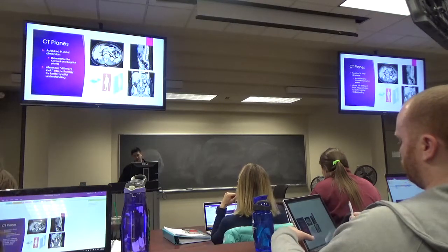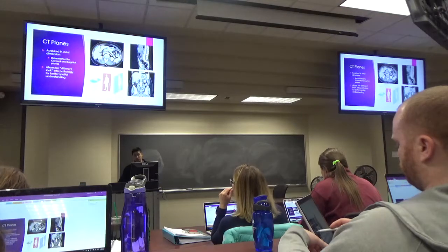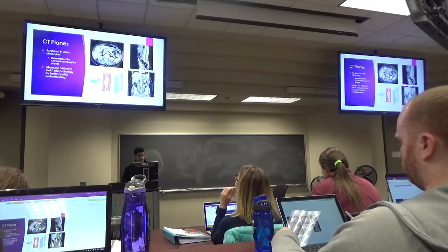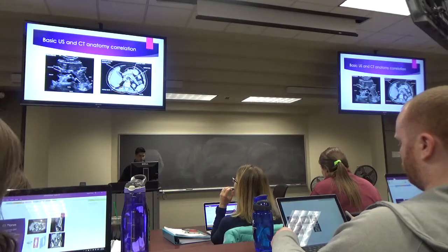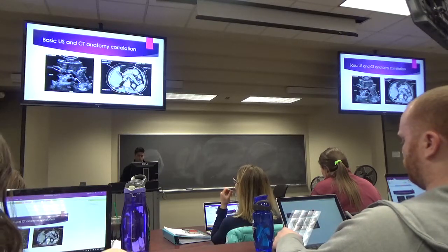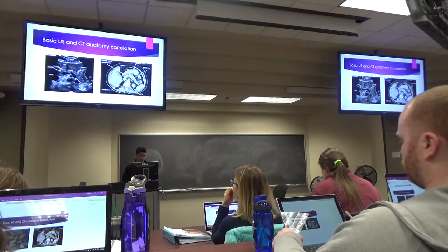So if you have a hard time wrapping your head around whether something is anterior, superior, or whatever it may be, having these different looks can really just be beneficial for you. And then I put this in there so you guys can just see the correlation between ultrasound and CT. But as far as anatomy is concerned, I wouldn't hit home too much with this unless it was part of your test.